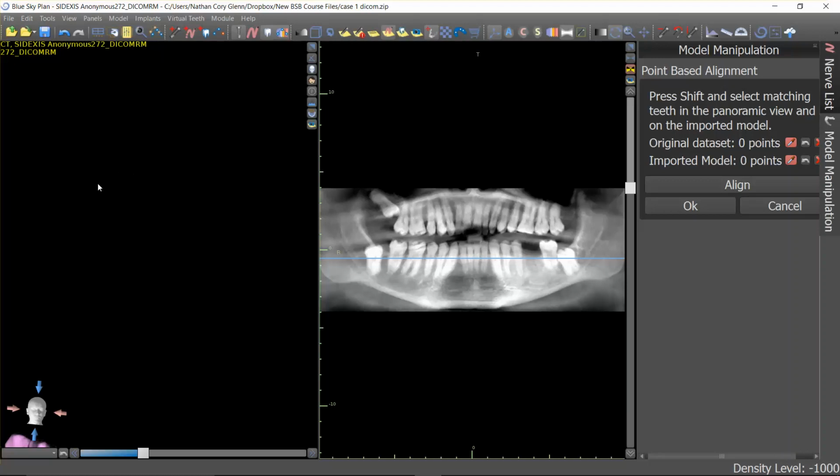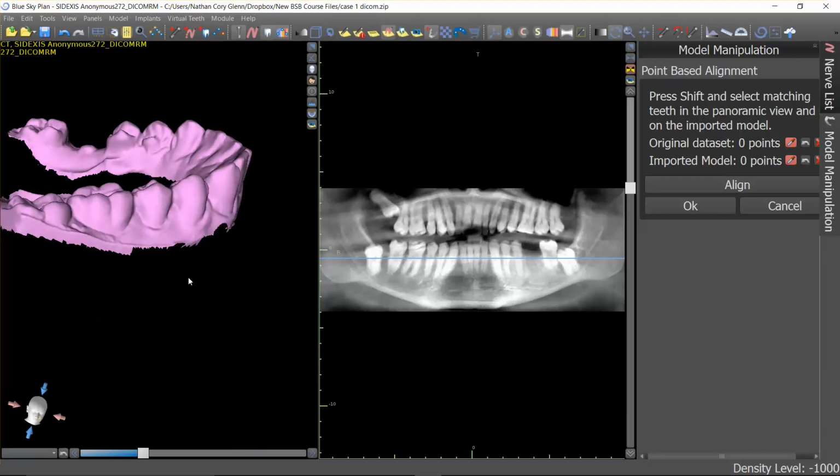Now you don't see it currently unless you look closely. Right here it is. If you don't see something, right click and pull back. That zooms out, and you ought to see this come into view. I can right and left click and now zoom back in, and we can see this STL in its entirety.